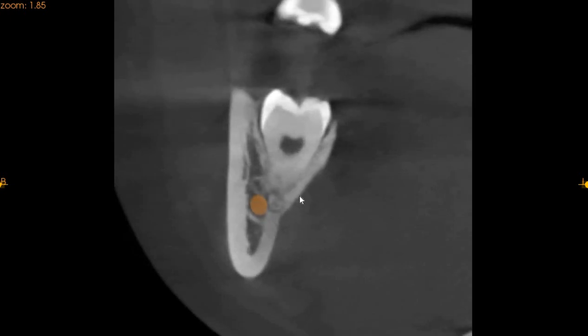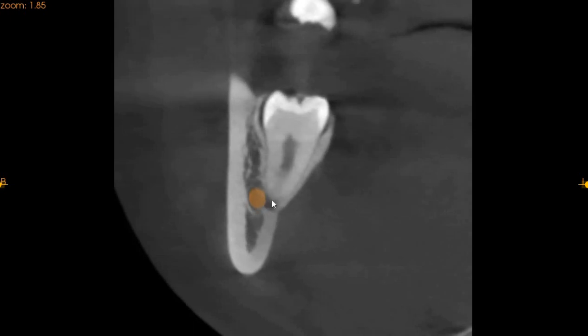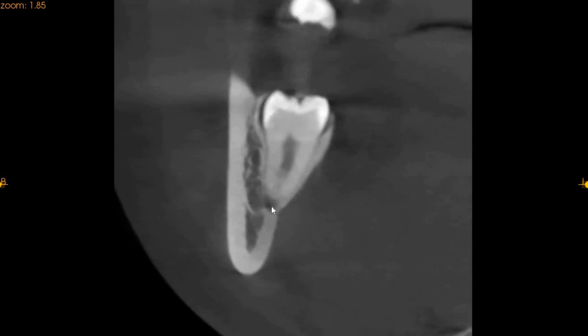As we are moving further, this is the distal root, and the distal root is actually right next to the nerve. Just to give you an idea, I'm going to remove the highlight. So this is where the compression of the inferior alveolar nerve happens because of the wisdom tooth. The inferior alveolar nerve is placed buccally to the wisdom tooth, so this is something to be kept in mind as well. Here the cortical plate becomes extremely thin.